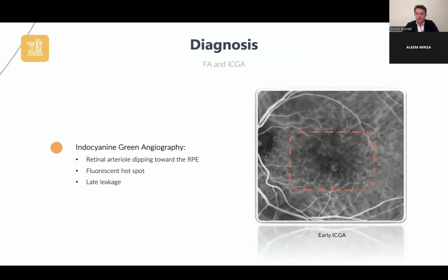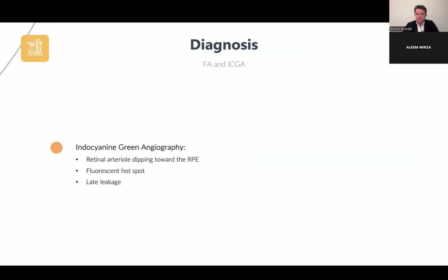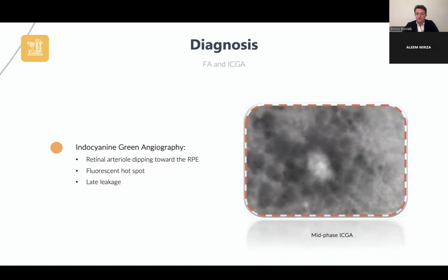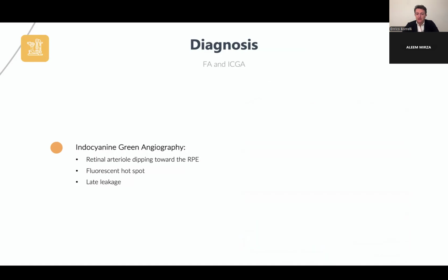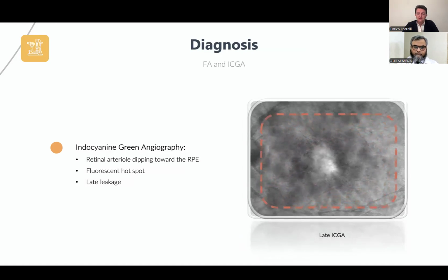I'm going to show you the late images in this case. There is some leakage in the mid phases. And if we look at the late phases, the leakage is even more evident, with also a fluorescent hot spot, as in this case.